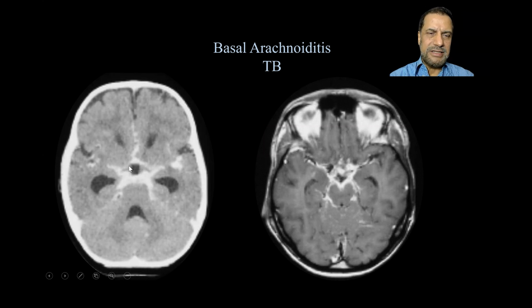So now coming to some of the infective lesions that you can see in this enhanced CT scan. If it were a plain CT scan, then you may say, oh, this is a subarachnoid hemorrhage, but this is an enhanced CT scan where you can see again a hydrocephalus there. The temporal horn is pretty big. It should not be visualized, or be less than 2 millimeters in an adult. So this is pretty big.